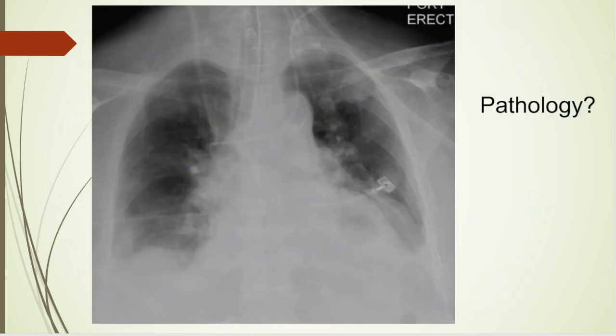All right, another chest X-ray. Let's see what's going on here. Looks like quite a bit. Let's start off with A for airway. You can see the trachea coming down. Looks like it bifurcates right about there. This appears to be the carina. Looks like there's an endotracheal tube right here. So that's okay. It looks like maybe 2 centimeters above. I would rather pull it back a little bit, but it's fine. It's above the carina.